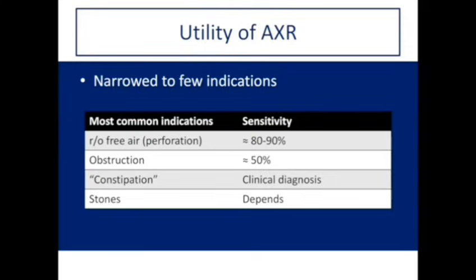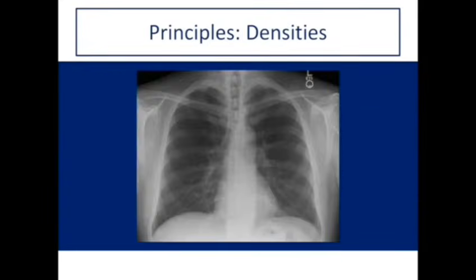When looking for kidney stones, non-contrast CT and in special cases ultrasound are the test of choice. Abdominal X-ray is generally performed here to see if you can see the stone, and if you can see the stone, the idea is that you can follow it up with serial X-rays. Now, let's move on to the actual imaging.